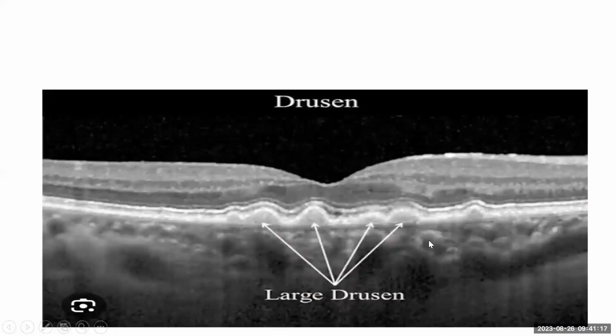Okay, so this drusen, large drusen, large drusen. The key word is location. They are below the RPE. They are basal laminar drusens and all. They are below the RPE. And you can see that the RPE is thrown into folds. It's corrugated rather than flat. The ellipsoid line also follows the contour, the same for the ELM, okay?